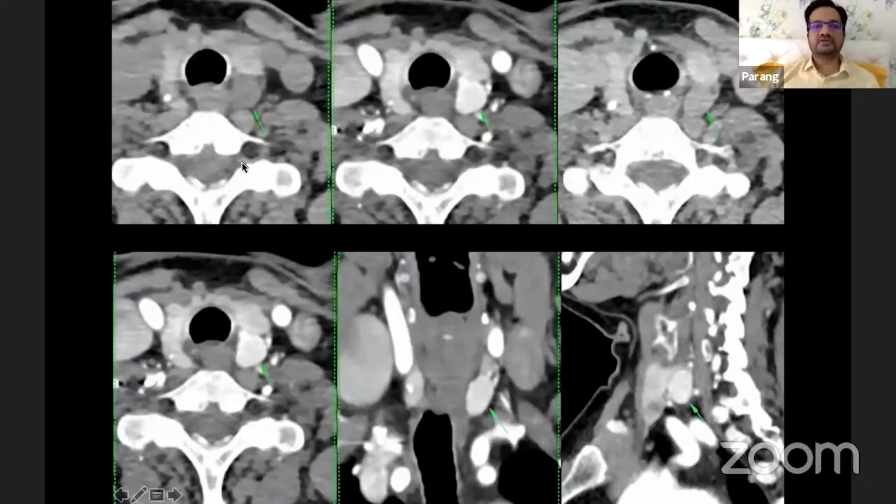This is one more female, 44 years, with hyperparathyroidism, with USG suggestive of bilateral parathyroid adenoma. Once we saw the CT scan, we also found bilateral lesions. But while USG could not discriminate whether both are parathyroid adenomas or not, CT scan clearly gave this discrimination. As you can see, there is a large hypodense nodule posterior to the left lobe of the thyroid gland, showing arterial hyperenhancement with a clear washout on the delayed phase. Even your 3D reconstructions give you the exact localization and enhancement, clearly suggestive of parathyroid adenoma on the left side.